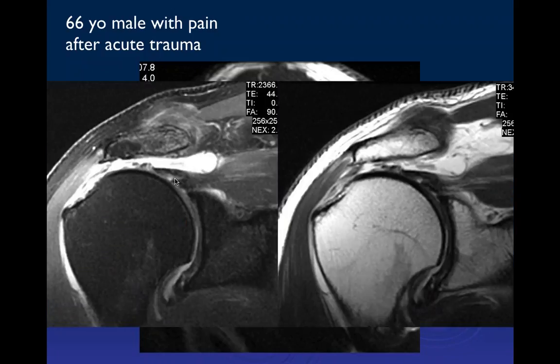If we go to the oblique coronal images, what we can see here is, here's the musculotendinous junction, here's a complete tear of the supraspinatus tendon, and there's medial retraction. Notice if we look at the muscle, there is no fatty atrophy in this muscle at all. This is one that just medially retracted, so this is a positive tangent sign, but there is no atrophy of the muscle here. So this is a person who would actually be a great candidate for surgery, and the tangent sign could be misinterpreted as saying he's not a surgical candidate.